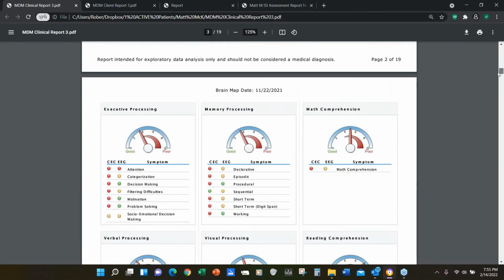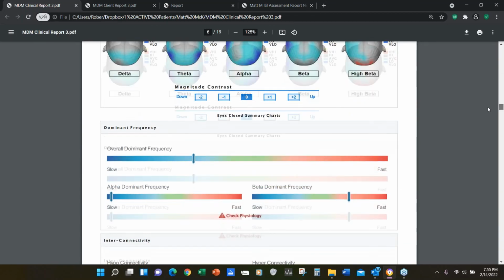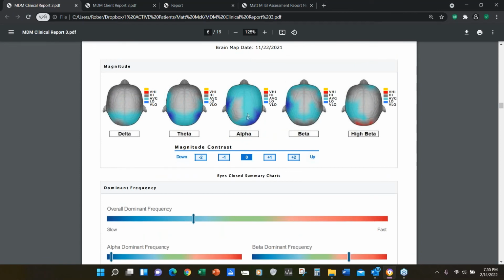And from the physiology perspective, I don't think there's anything more I would add to what everybody else said, other than I would point out in this guy's case, to tie it into the physiology, I would say, you see here, you indicated you had some adrenal stuff. I would point out that this low alpha here supports your symptoms. This is what it looks like when people are really stressed out and wind up running themselves into the ground with adrenal fatigue. What we don't see here is the elevations, at least eyes closed, in the delta or theta range. So I don't worry about that.